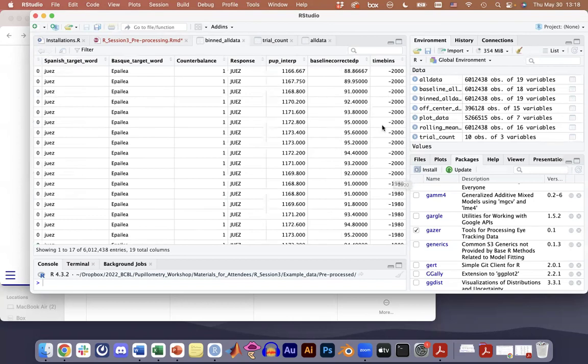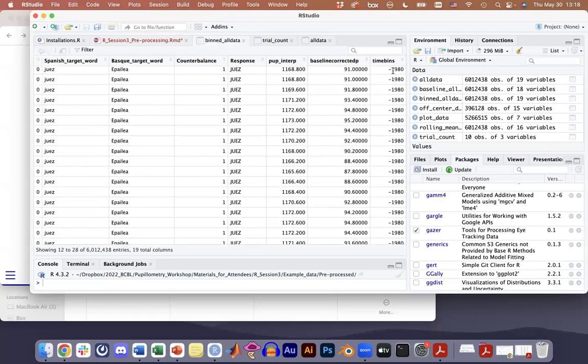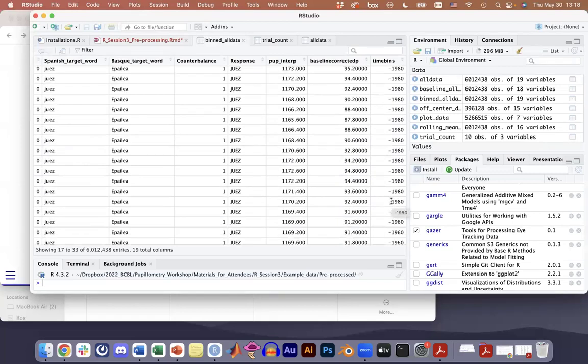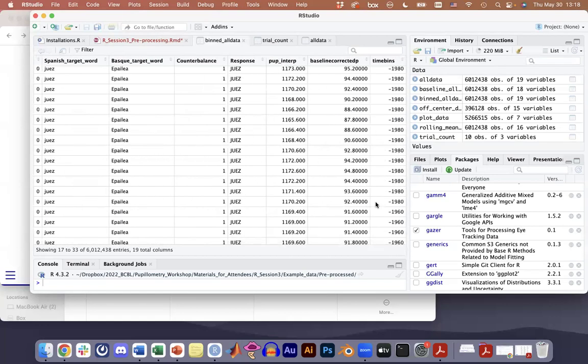The good news is we don't actually analyze the data from here. So if it starts on a bin half the size it should be, it won't break things. So we can see the -1980 goes for 20 rows. Does that make sense, Sandy? Mine looks different, and I don't know, but it's potentially just mine. I don't know why. Maybe I've run something. Yeah, I don't know.